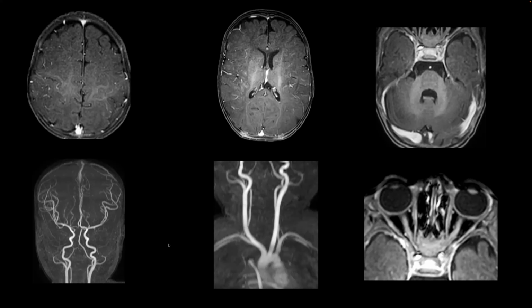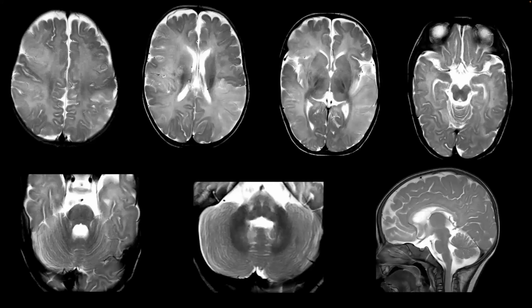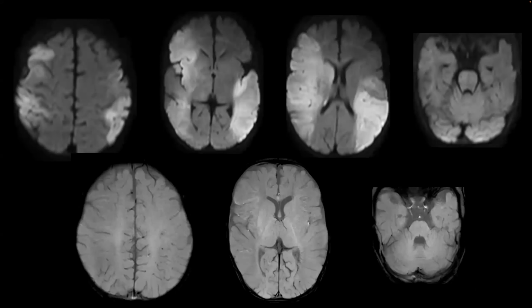And the other thing, what we thought, if it was primarily infarct, there is cytotoxic edema over there. If it was a single event, or a single ischemic focus, but the deep gray nuclei changes don't show any restricted diffusion, especially the thalamic regions. The left basal ganglia doesn't show any abnormalities. So with only infarcts, I think it would be one stage rather than having a differential pattern of edema. Hence I was favoring more of an infective process, with a cytokine storm causing these changes, possibly para-infectious.